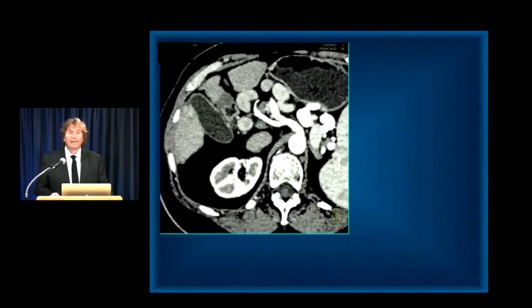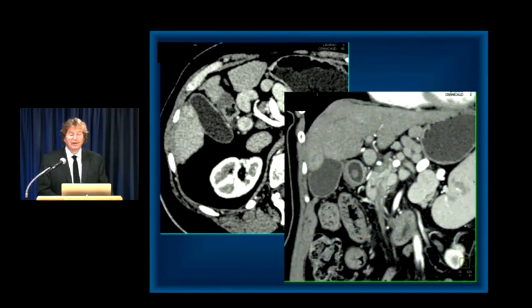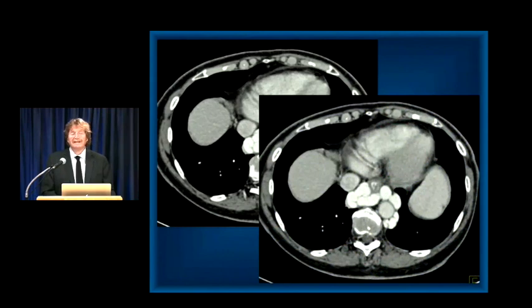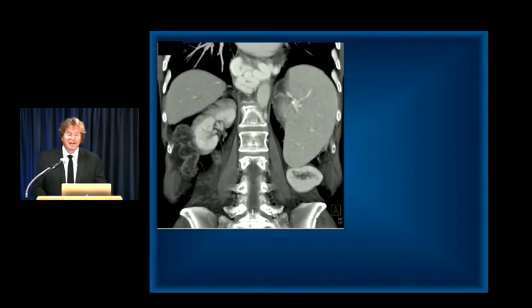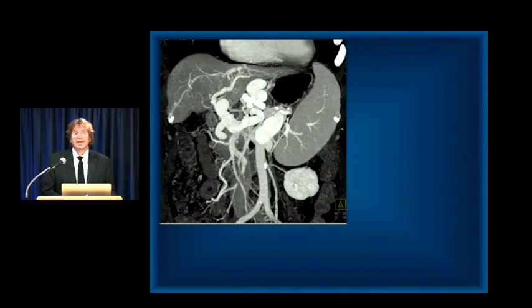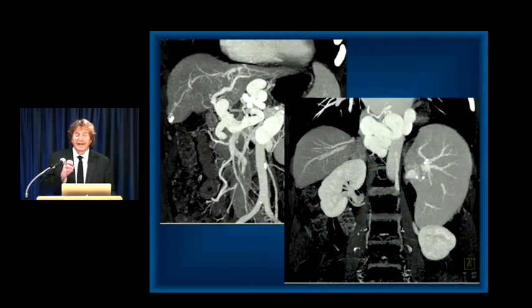Well, when you go from the patient's arterial phase and then you go back to the venous phase, now you see the large varices. Lower esophagus, gastric fundus can be large, bulky varices which look identical to adenopathy, and you can confuse with adenopathy. You also can confuse it with an esophageal cancer, perhaps. Look at the extent of the esophageal varices and the varices along the celiac and SMA. So again, you need to be very careful. Here's a few more images. Again, MIP is really good for this, but again, it's important to be thinking about that possibility.